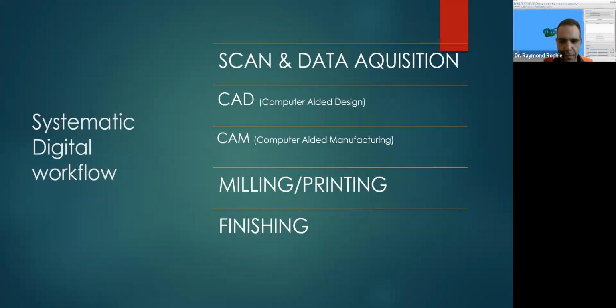And for this case, I have actually two workflows. I hope that we have time to review them, but we'll start by working with a model imported from a CT scan. So if you don't have yet a desktop scanner or an intraoral scanner, but yet you want to do guided surgery, either to design it yourself or to outsource it to Lab Pronto, what you can do is grab your CBCT scanner and just place your model on and take your scan, and BlueSkyPlan will import it for you.